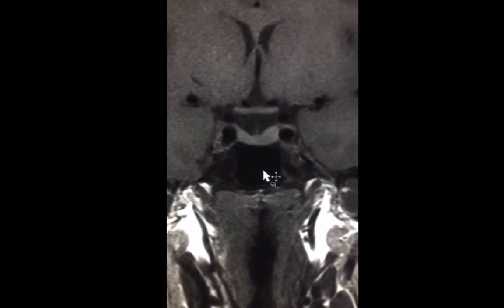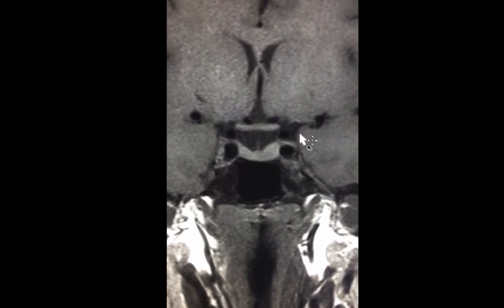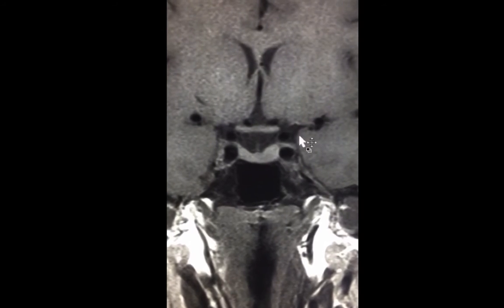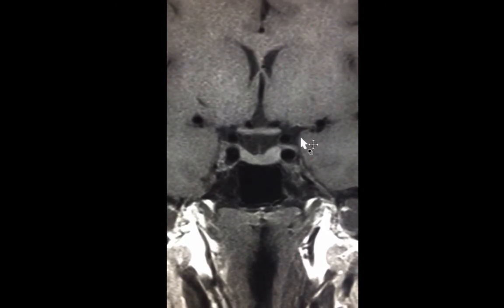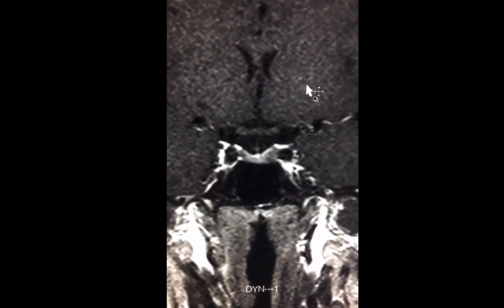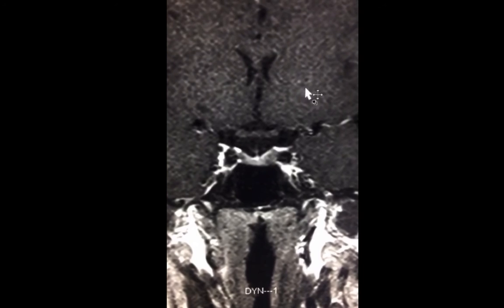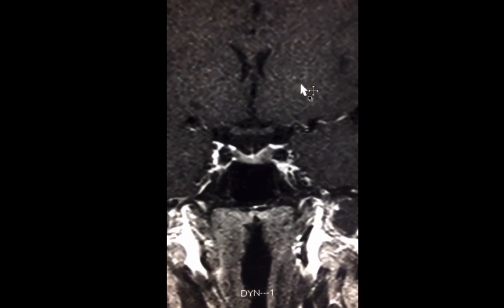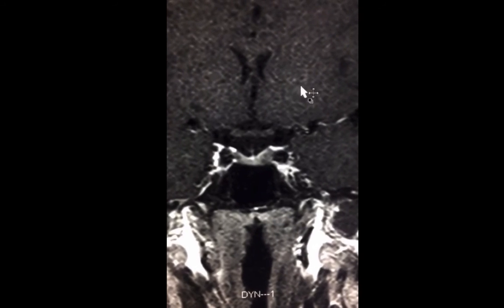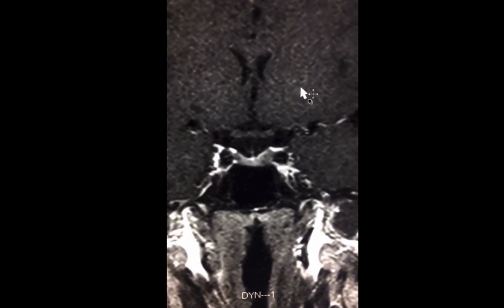But do you have a microadenoma? Without administration of intravenous contrast, microadenomas may be missed, since most of the microadenomas are iso-intense on T1 and T2. The way to look for microadenomas after giving contrast is to do what we call a dynamic post-intravenous contrast acquisition. By dynamic, we mean giving the contrast and following the enhancement of the pituitary gland by performing several images over time.